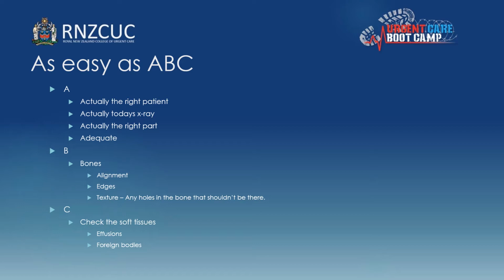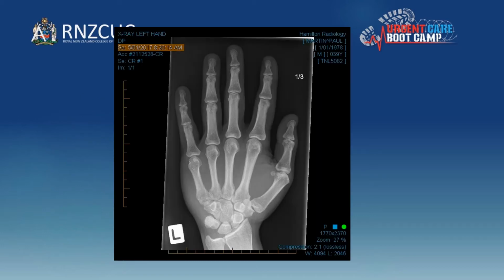Then I advise you look around the bones, look at the alignment and the edges, and look at the texture of the bones to see if there's anything weird going on in there, and then have a look around the soft tissues to see if there's any other clues as to what's going on, with signs of swelling, effusions, and foreign bodies. So we'll look at this individual's hand, and you can see that it's me, and it was taken a few years ago, but check with the date that it is the one you're thinking of.